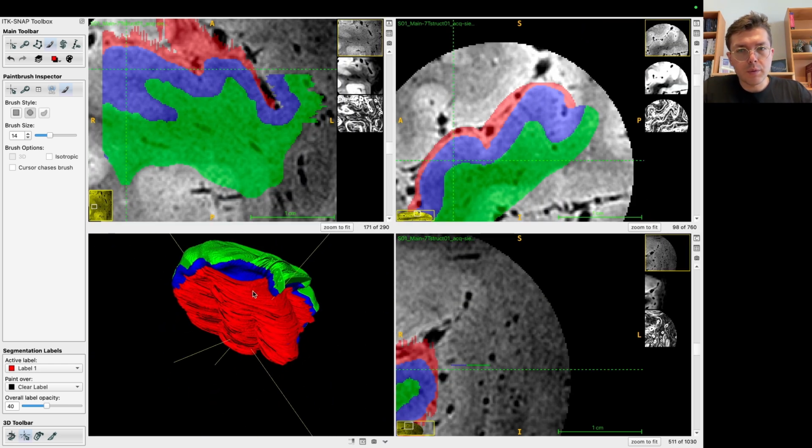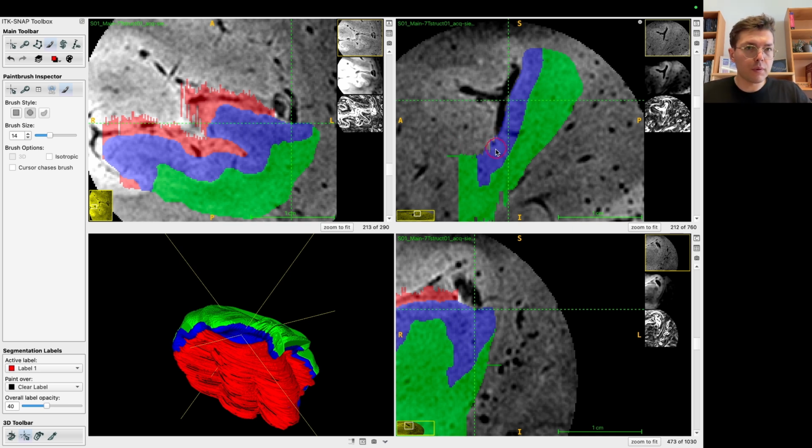Okay, I covered it more or less. Let's put a bit more work here.